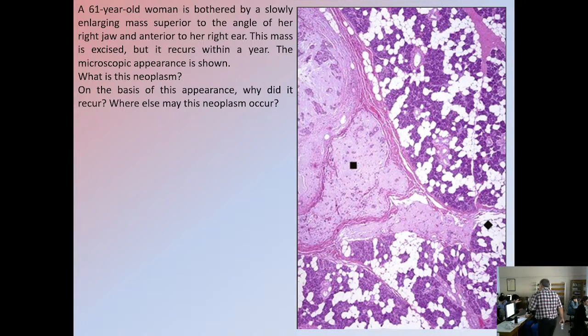So you see that despite being a benign lesion that does not metastasize, if it's a pleomorphic adenoma, it has these projections into the normal appearing tissue. You see this projection here of the tumor? You see this? It's not invasion, it's just a projection of the tumor.